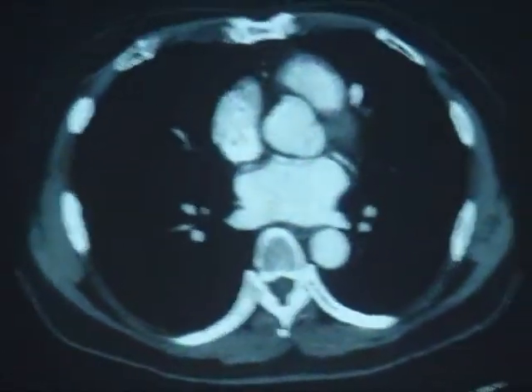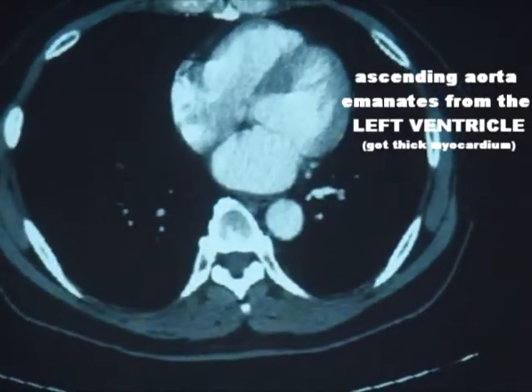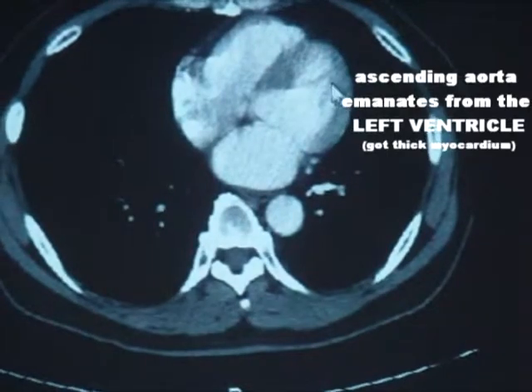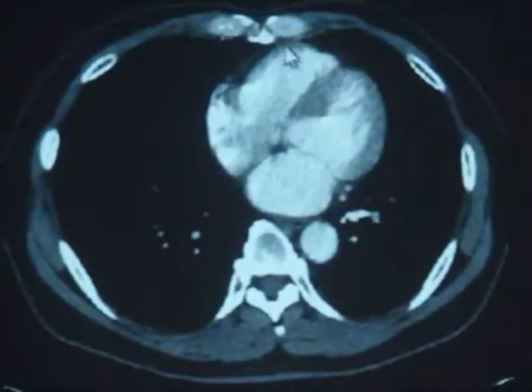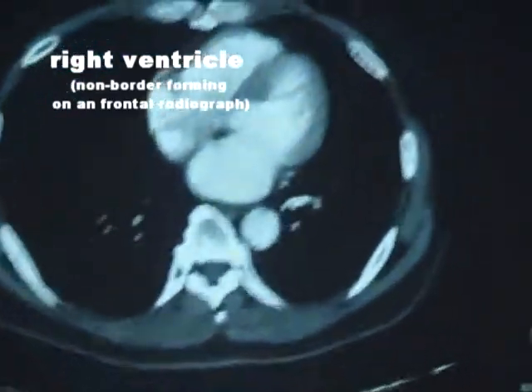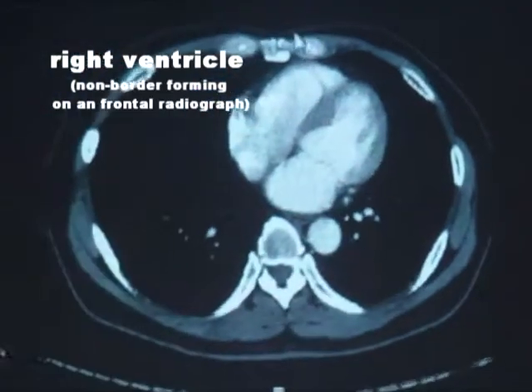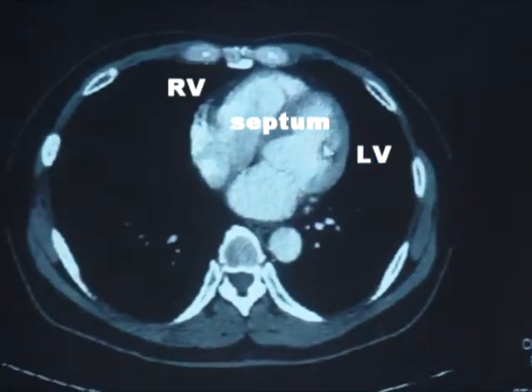The ascending aorta emanates from the left ventricle, and that's the left ventricle. Left ventricle, thick myocardium. Okay, right ventricle is anteriorly located. It's non-border forming on a frontal radiograph. Okay, so this is the septum, right ventricle, left ventricle.